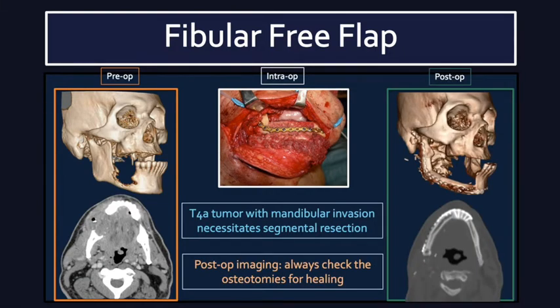The postoperative result is wonderful. You've got a nice normal anatomy restored. In this case, the bone looks healthy. The cortical bone thickness is maintained. The medullary cavity fat looks clear. The osteotomies have healed, and the flap to native bone anastomotic site is healed.